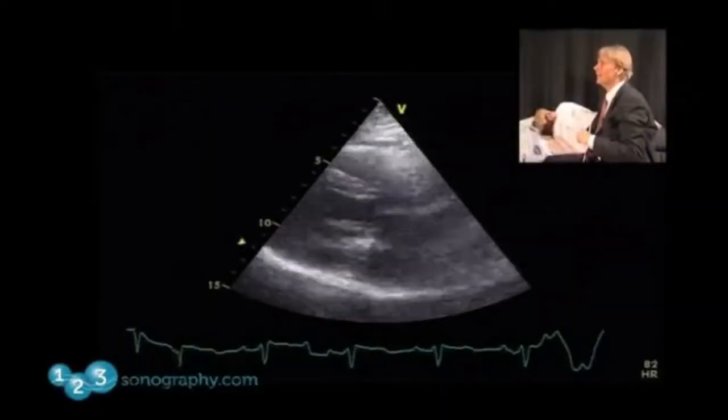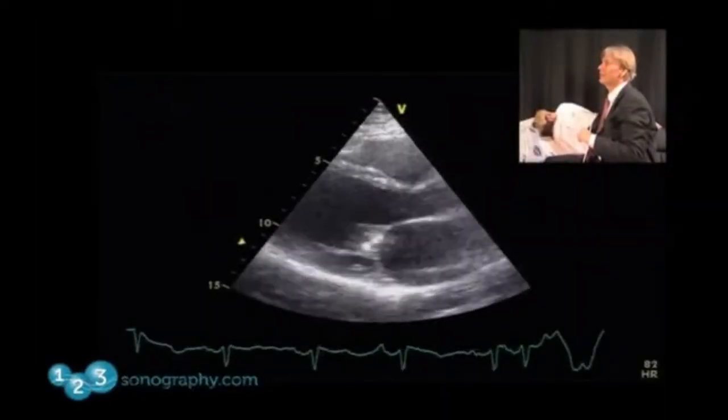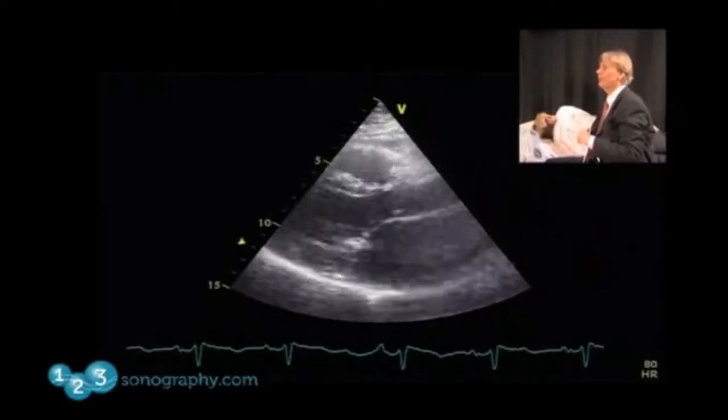because this confirms our primary impression that the mitral valve opens quite nicely. This is actually also appreciated when you look at the parasternal long axis view. You see that there's doming, but the valve does open quite nicely.